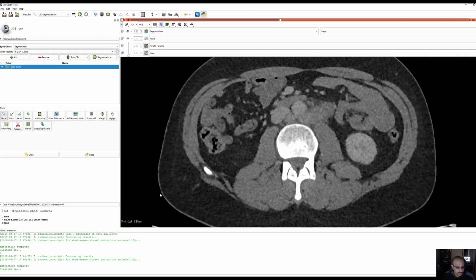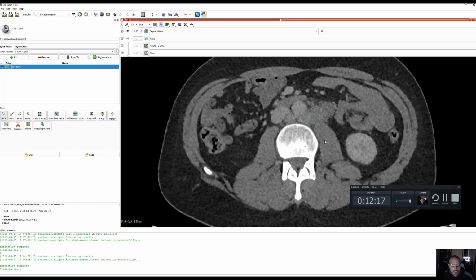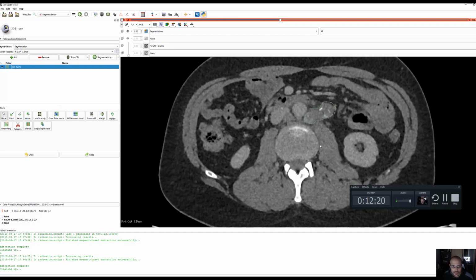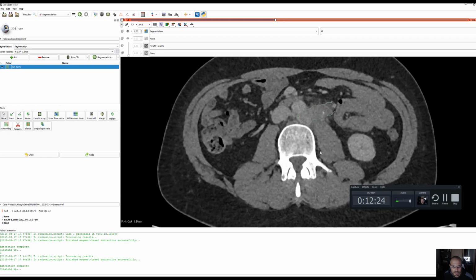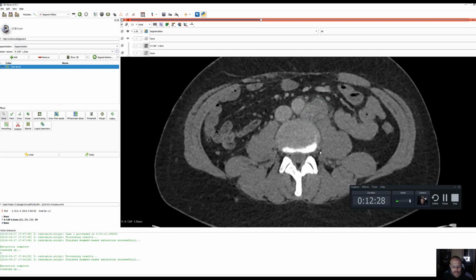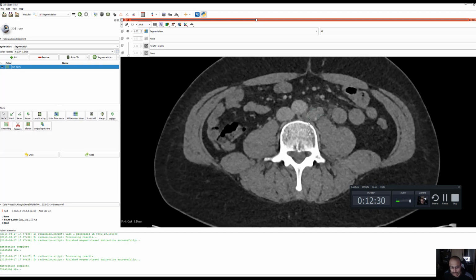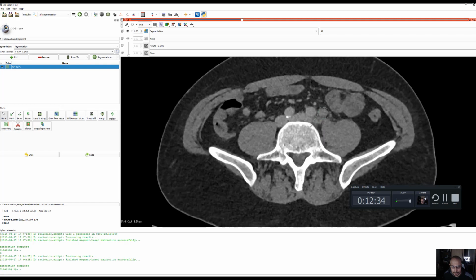and yeah. Okay, well, but now I've messed this one up. Okay, I can Control Z it, and it goes back. I think it's important that we just have one segmentation at a time. So this is how it should look. If you've got an additional copy of the same segmentation, then you might want to get rid of it.